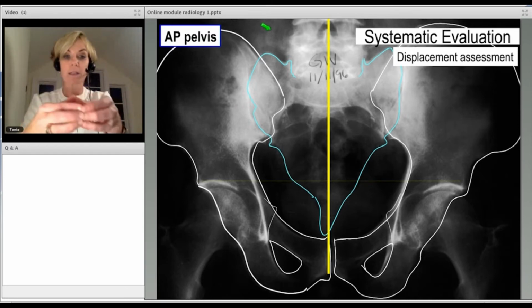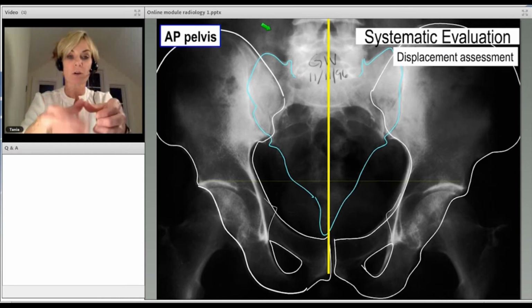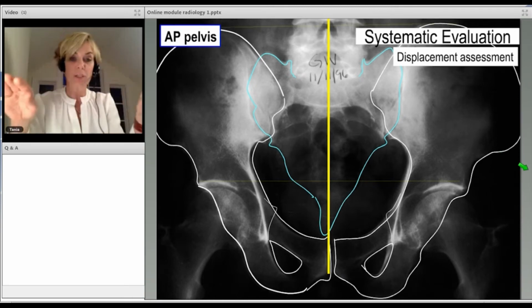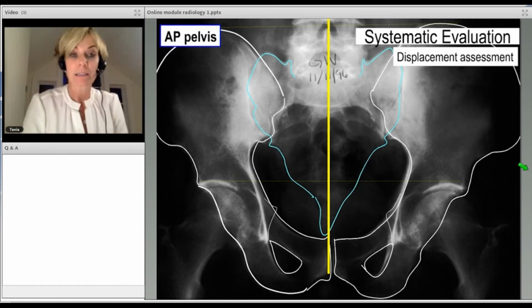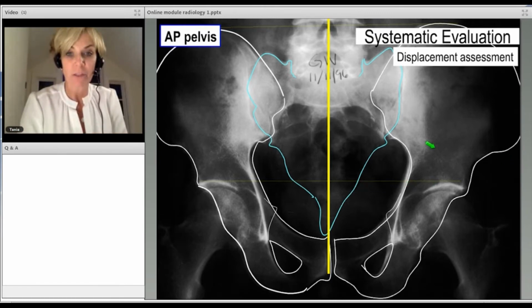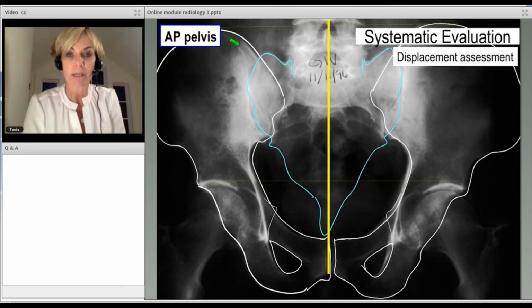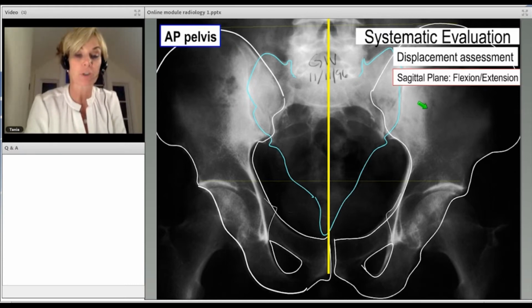So if one of the radiological roofs is cranially displaced or caudally displaced, the posterior pelvic ring doesn't look to be displaced, so I drop another line at the posterior pelvic ring, that might indicate a flexion extension deformity. So if there's a substantial change in the radiological roofs but no change in the posterior ring, that might indicate a flexion deformity, for example. If both the radiological roof and the posterior ilium are displaced with respect to the contralateral side, that might indicate a cranial displacement or translation.